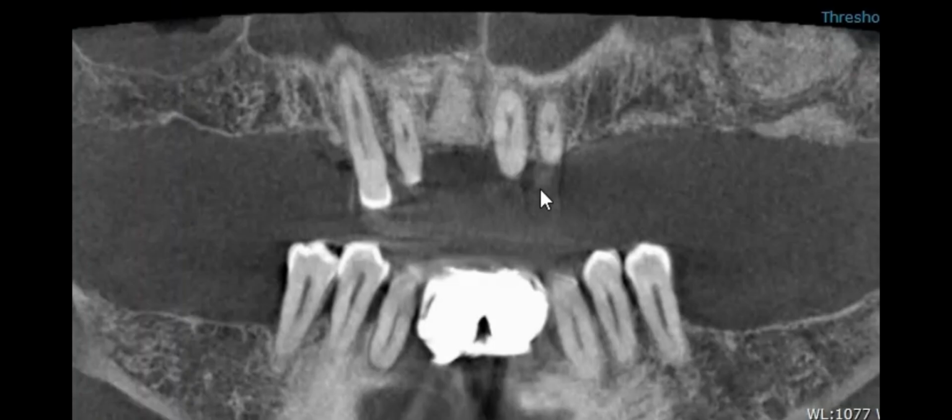Now, if you look at one of the other sectional views of the 3D X-ray, you can see here we've grafted that front area here, and that dense area of white here is indicative of that. Over here we've grafted that area of the ridge where the root was sitting there and the bone was damaged. But also up here, importantly, we've done a sinus graft procedure and increased the bone quantity and volume in this area significantly.